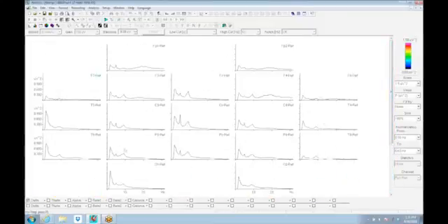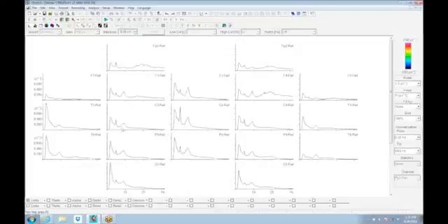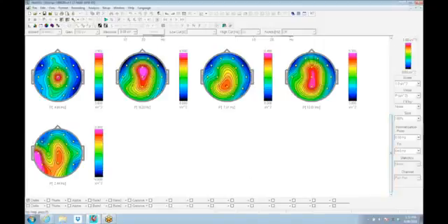And these are the raw spectra as they were pulled in. These raw spectra basically had, as we saw in the raw EEG, various frequency components to them. Now, we also saw that the slow content at T3 was largely artifactual, and we can do a map of a slow wave that shows some of the slow area that ended up having artifact over here from movement and electrode issues. But the mapping is very flexible.